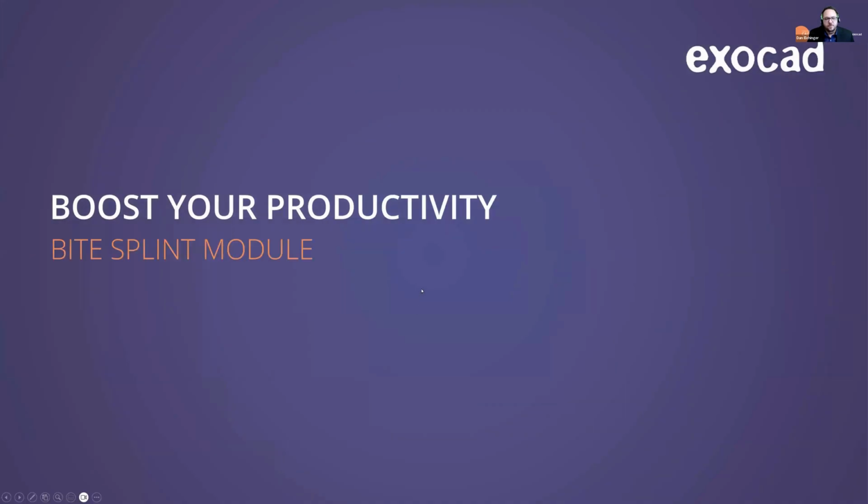And then bite splints. What we'll do today is incorporate our implant planning project, design the immediate load, and then design a bite splint to protect that implant while it's healing.